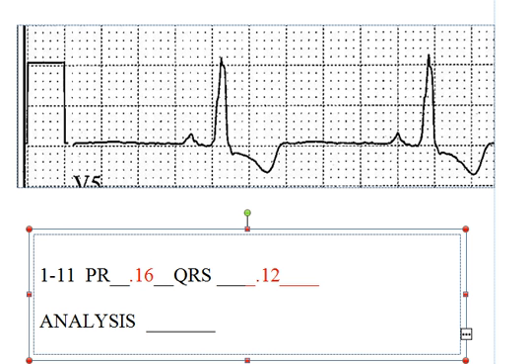Now, I didn't mention it in the other couple of strips, but this guy has an inverted T wave. He has this QRS, it comes down to the S wave, it starts going sideways here, and then it goes whoop, down, and that's a T wave. We call it inverted because it's going upside down. We saw an inverted T wave, but I forgot to mention it in partial strip number 1-7 and also partial strip 1-9. So here we've got another one.